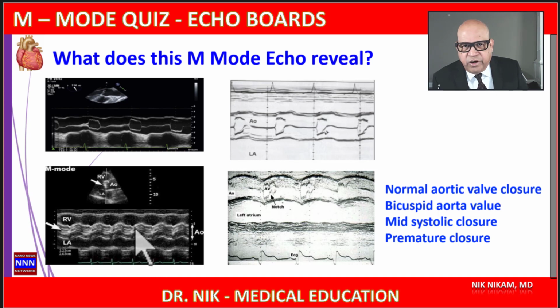There is reduced aortic valve opening, and there is eccentric closure of the aortic valve. So all these findings suggest we are dealing with aortic valve pathology, which may be degenerative in nature, and we need to look for other clues in the left ventricle.